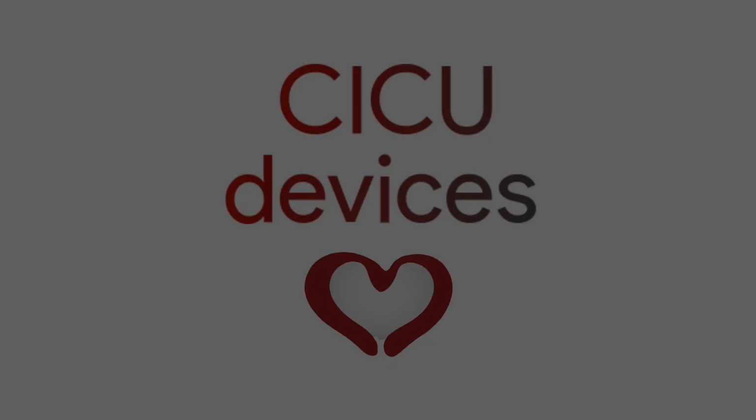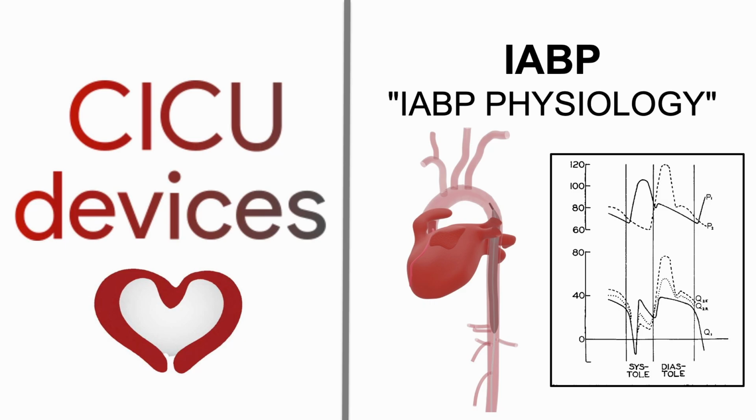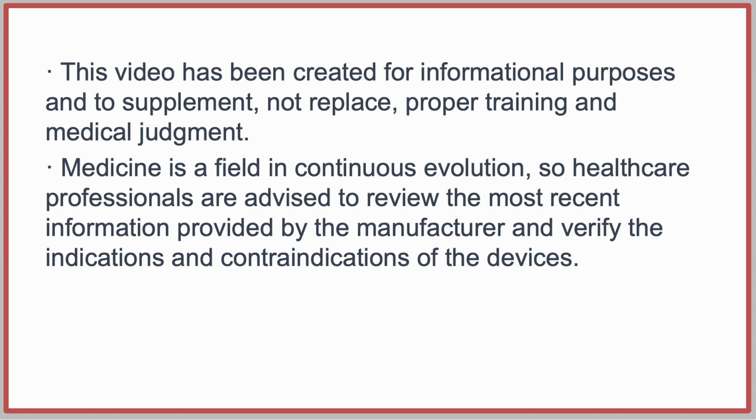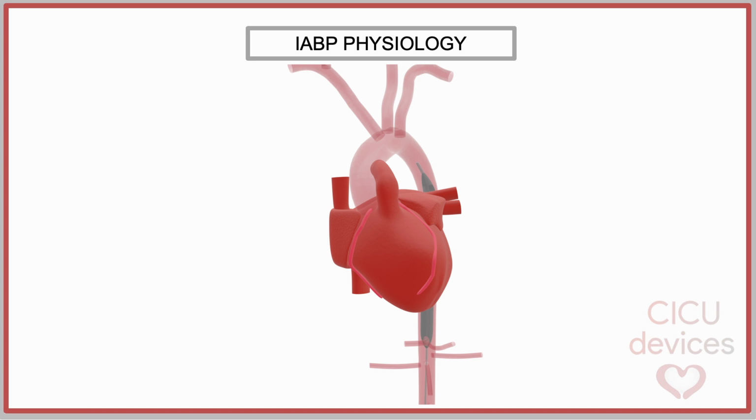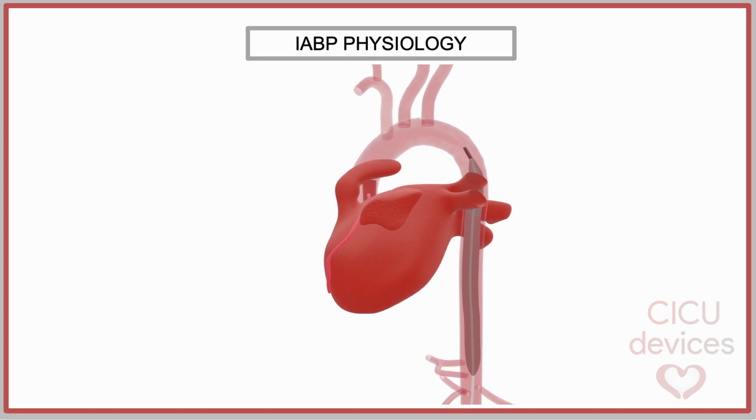CICU devices. IABP Physiology. In this animation, we can observe the operation and synchronization of the counterpulsation balloon with the heartbeat. In the following minutes, we will explore the physiology of the intra-aortic balloon pump in detail.